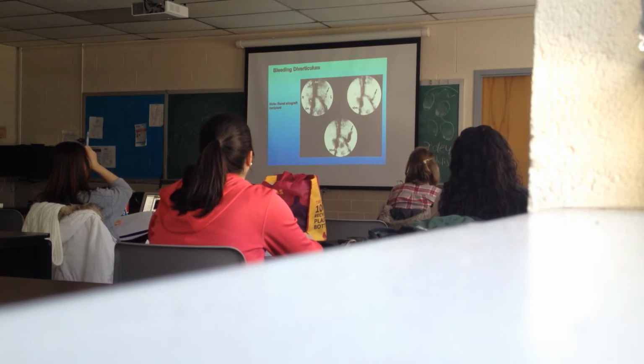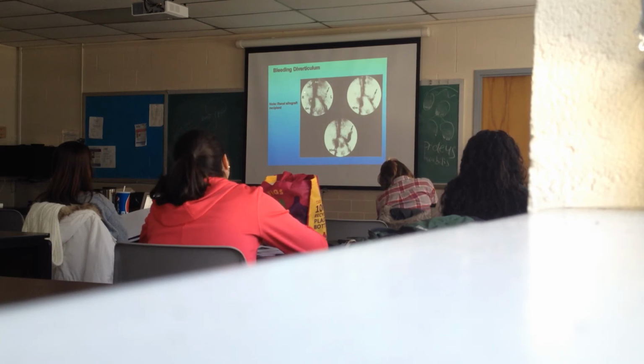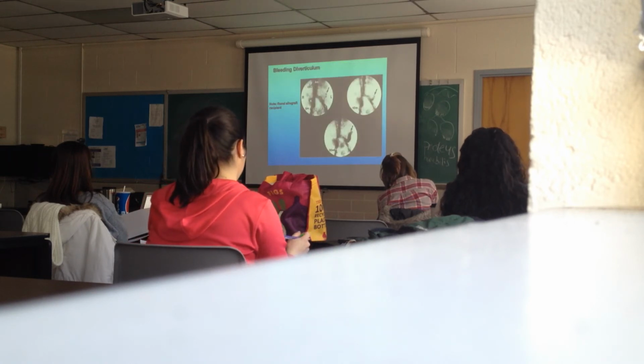Okay. These dark areas, are they more radioactive than these light areas? Which area is more radioactive? The dark area or the light area? The dark area is more active. Right. That's where the activity is accumulating, so naturally that's where the RBCs or colloid or blood, whatever is radio labeled, is. It doesn't give you a pretty picture, but it does give you a functional map.